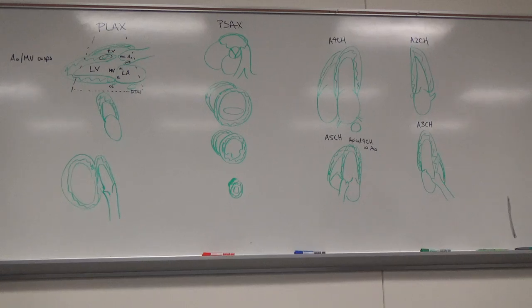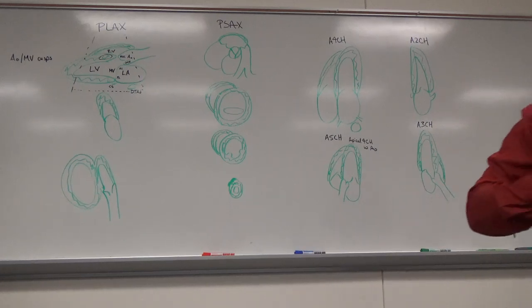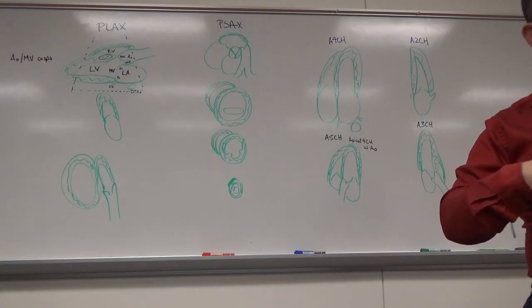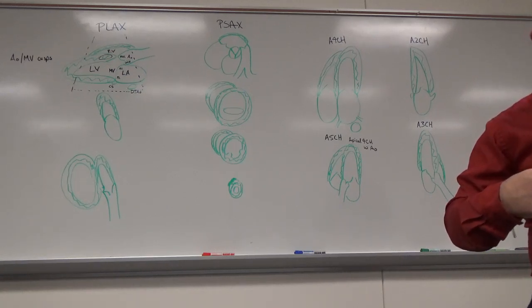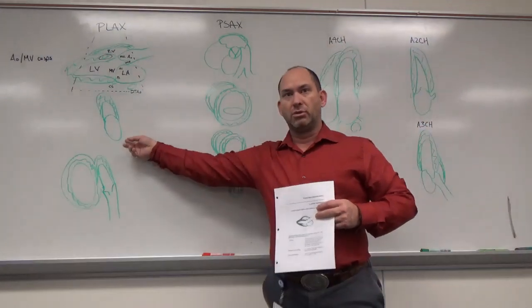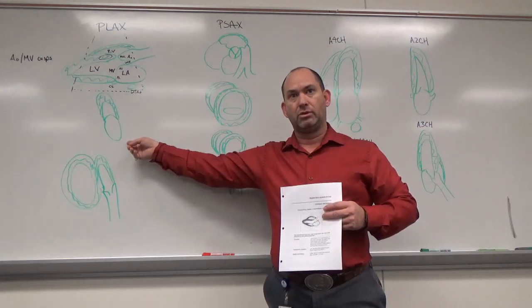So it's got the pictures of the slices there. On this, it's got the sectors that are drawn over it, but pay very close attention to where the sector is. This is parasternal long axis. So you're going to get to some others like this. This can look like a two-chamber view, but it's actually the right ventricle.